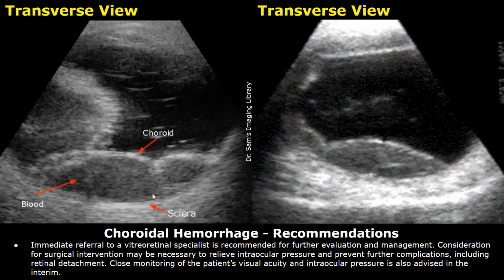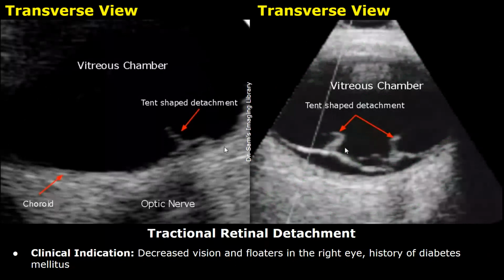Recommendations include referral to an ophthalmologist and consideration for surgical interventions. Here is an ultrasound report of tractional retinal detachment.